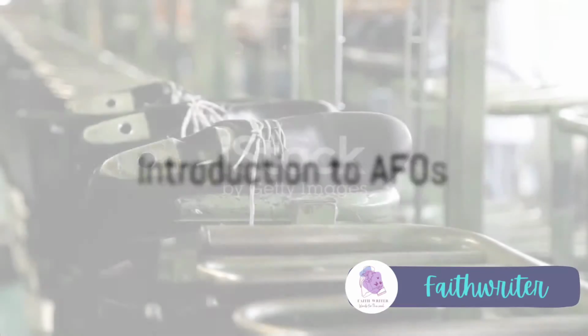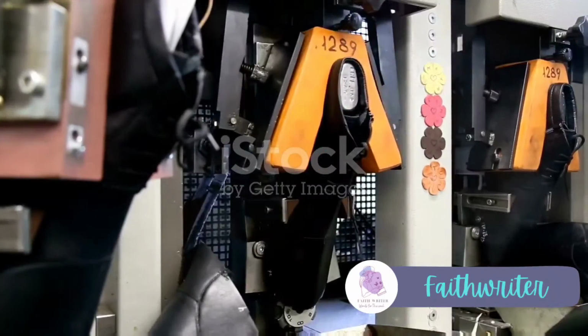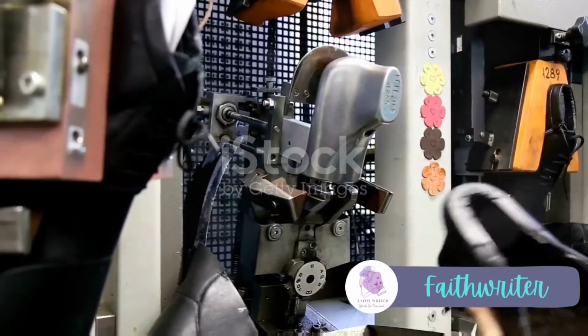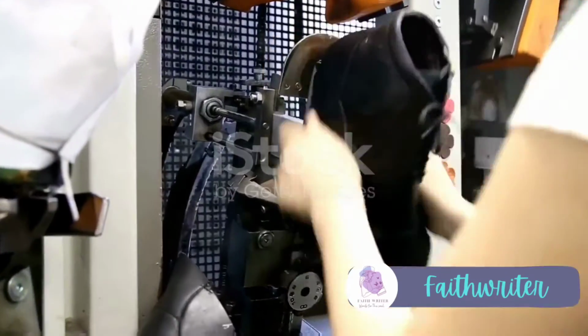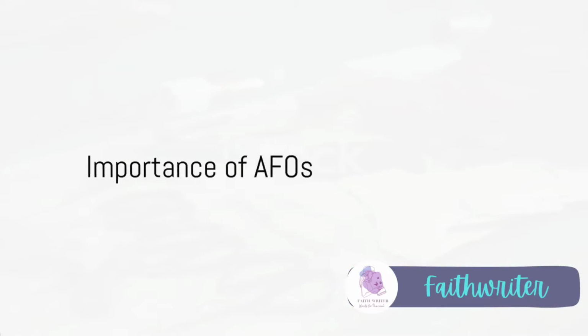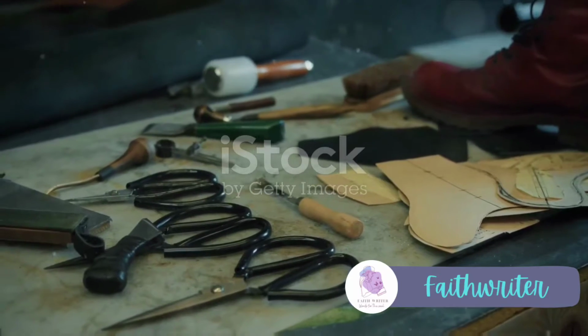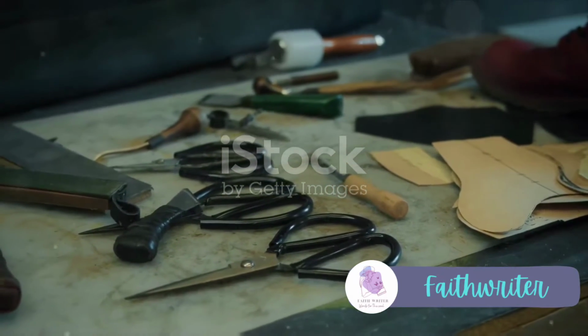Ever wondered how ankle-foot orthosis, or AFOs, are made? These medical marvels are designed to offer support, stability, and control for the ankle and foot. Their creation is a fascinating process that blends medicine, technology, and manufacturing expertise. AFOs serve a crucial role in treating various conditions like foot drop, cerebral palsy, and multiple sclerosis, all of which affect the stability and function of the ankle and foot.